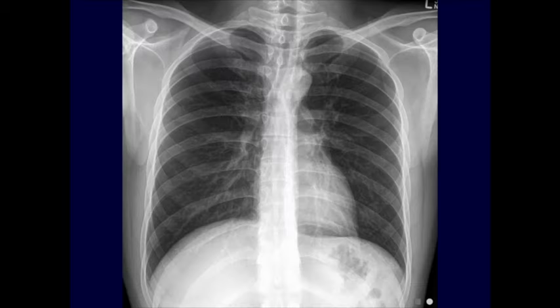This is a chest x-ray. When most resources try to teach you an approach, the first thing that they tell you to do is to look at a bunch of quality things like patient name, date, a few technical things about film quality. I'm going to skip over most of this. A lot of basic chest x-ray resources give you a laundry list of things to think about when you're looking at chest x-rays, and to be honest, it can be a little bit overwhelming at first. So let's keep it simple and focus on the basics.